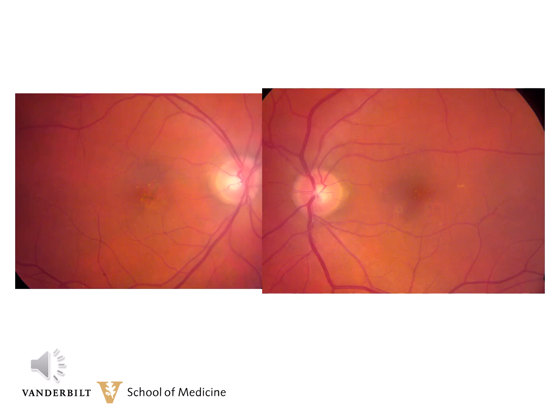This is a 67-year-old male who's had some blurred vision in the right eye for several weeks before presentation. His vision is 20/30 in both eyes. You can see on the color photograph of the right eye, there's some diffuse RPE changes and a little bit of pigment migration centrally. You do not see any drusen throughout the macula. The left eye has even more subtler pigment epithelial changes.